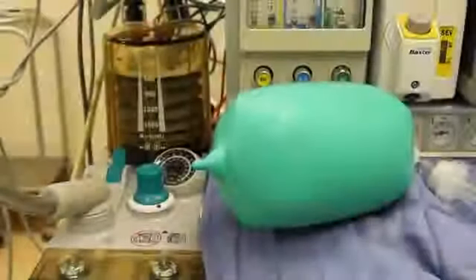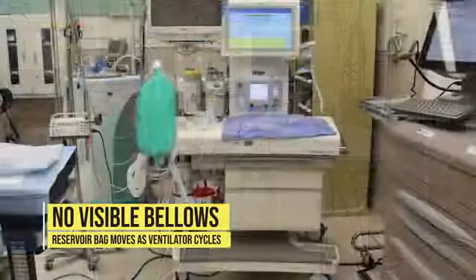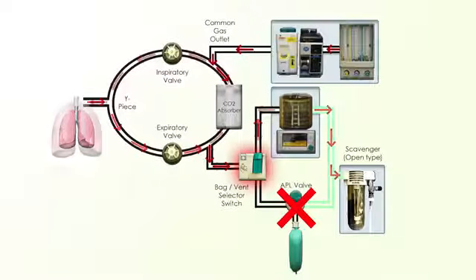There are numerous types of ventilators, including bellows, piston, and turbine-driven. When the ventilator is turned on, the APL valve is bypassed and therefore no longer used. Instead, the ventilator itself is set to regulate pressures within the circuit.